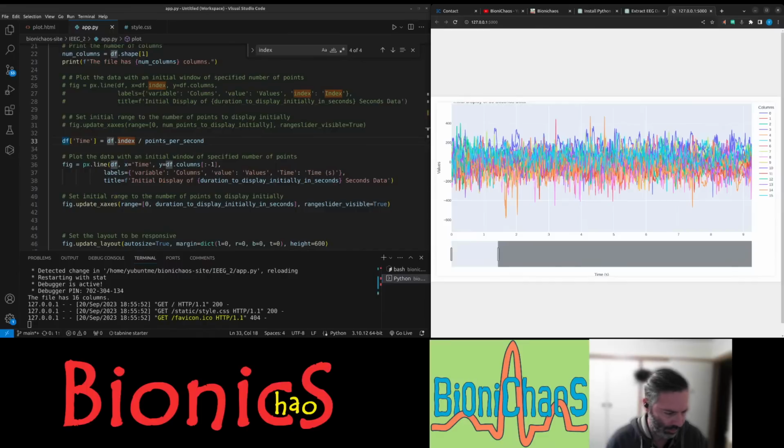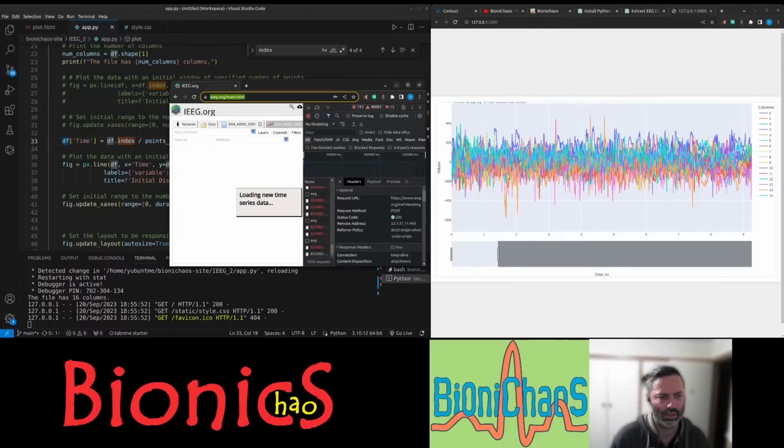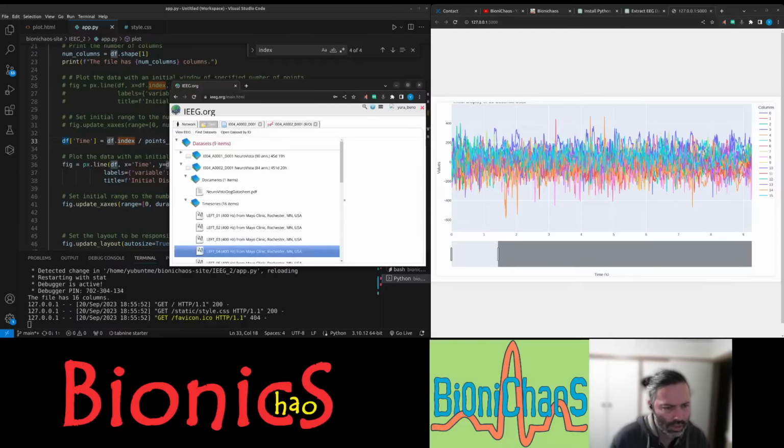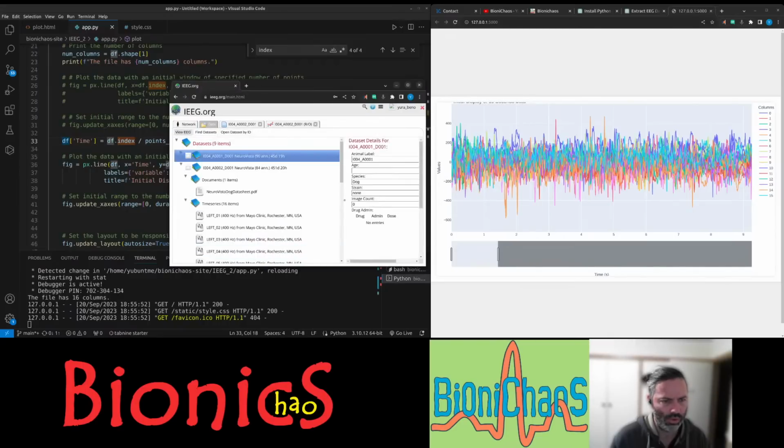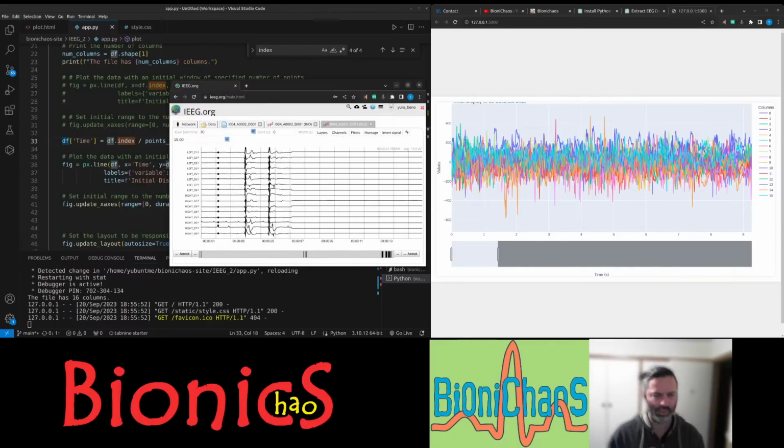Okay, we only got 15 minutes or so. Let's check. Yeah, this one's still loading. Maybe there's something wrong with that specific data. I'm pretty sure it's okay because I was using it before. All right, this one's loading fine. It's like, what? Stop that.